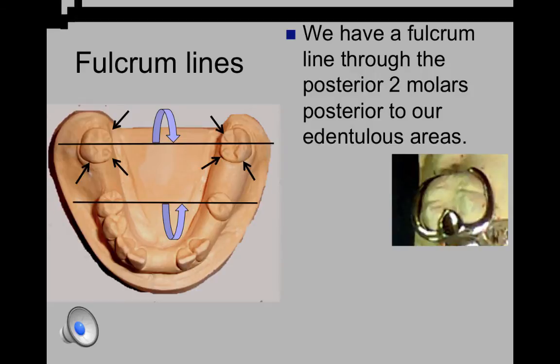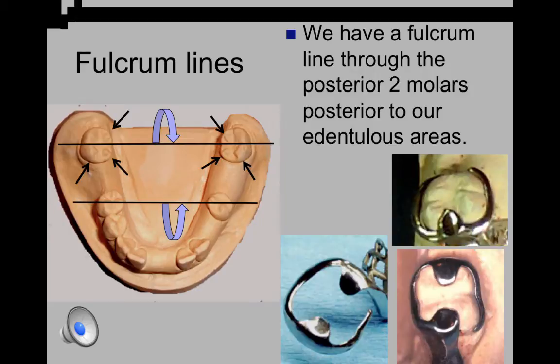Another choice for the posterior molars is the mandibular ring clasp. It has a mesial rest, a reciprocal component leading to a distal rest, and then the direct retainer arm originates from the distal rest and goes into either a mesiofacial or a mesiolingual 0.01 undercut. Which is the best choice? It depends on your survey lines on the tooth and what modifications can be made to the tooth without getting into dentin or mutilating the tooth.